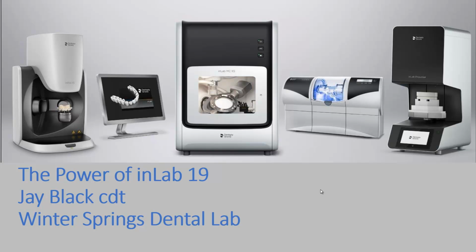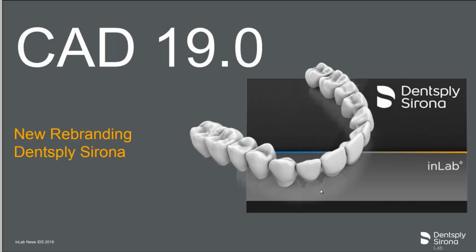In this webinar, we're going to go over what is new with the inLab CAD and CAM 19 software. First of all, we're going to have a new rebranding of Dentsply Sirona.